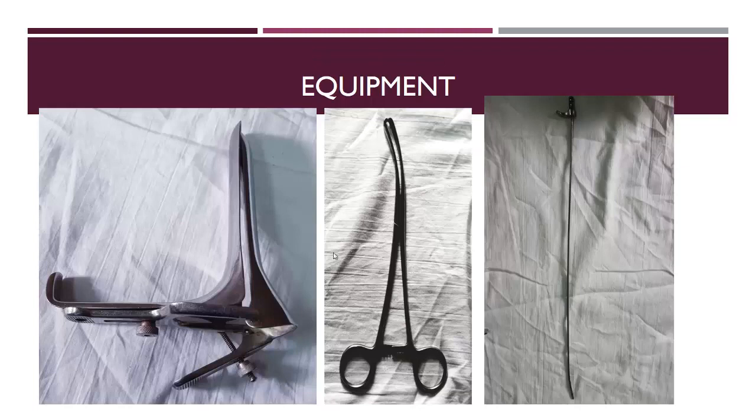These are the equipments used. We have here a Cusco speculum, a Volsellum, a multiple toothed Volsellum, and we have a sound. And this sound is very important. When you find resistance, sometimes there is tightness at the level of the internal os, so you have to introduce the sound in order to pass this tightness.